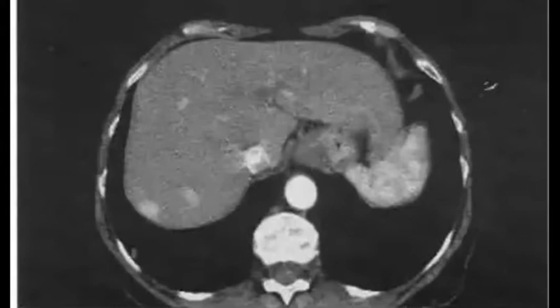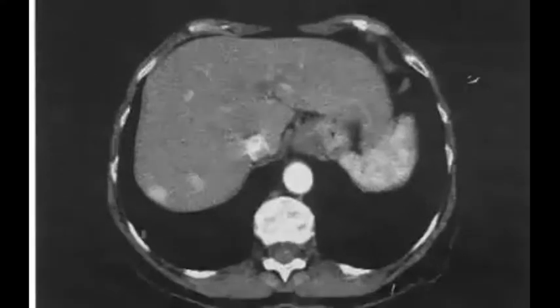So the differential diagnosis could include metastasis to the small bowel, liver, or a primary small bowel carcinoma with liver metastasis, which is the typical case here. When you ask about the history for the MCQ issues, you are looking for diarrhea and flushing. So if they give you, for the FRCR 2A, anything in the question about diarrhea or flushing or anything similar, you are talking about carcinoid.